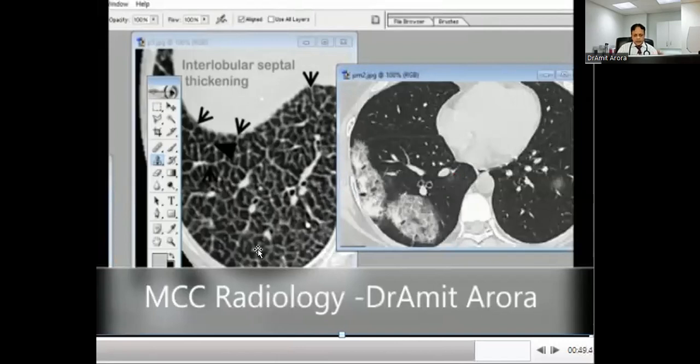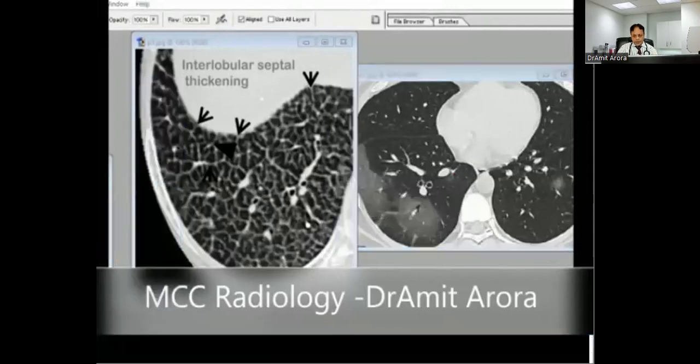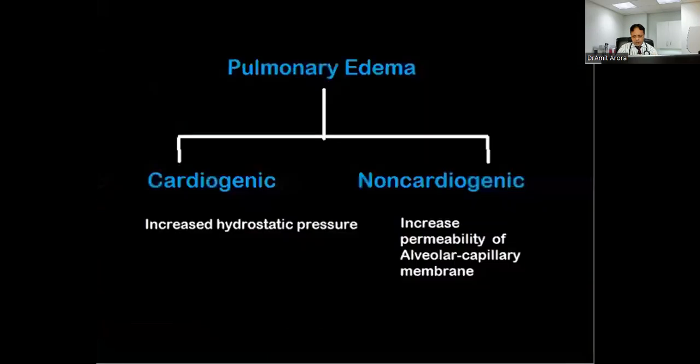Not that much appreciated because you are looking at it on a phone right now, but it's a typical crazy paving pattern. This was to demonstrate only. Okay. So I have made several videos like these just for demonstration purposes. So that was a little bit about HRCT. Also we have a lot of things.